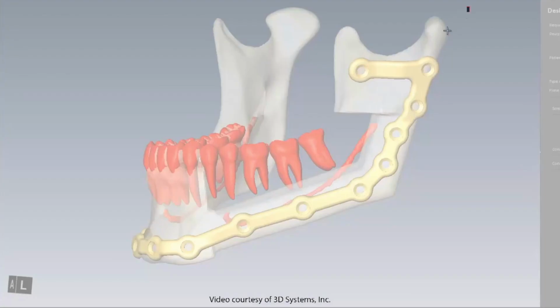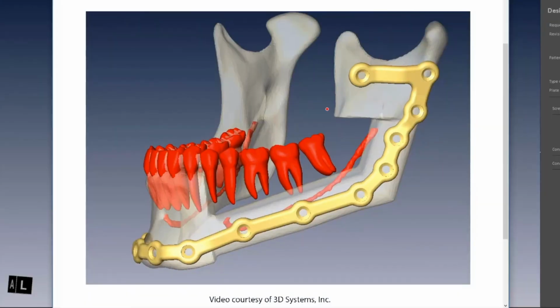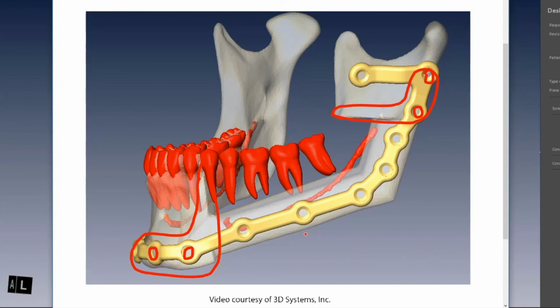Absolutely. For example, we're going to use two guides, one for each here. We've got that one with the marking wall up in the back here. That would go about only as high as we need to, only using as much anatomy as we need to make sure that we're locating that in the right spot. That would include a predictive hole here and here. And then up front, the one with the cutting slot reaching across that symphysis, like you mentioned, to make sure that we are registering that to the right position on the mandible. That would also include a predictive hole here and here.